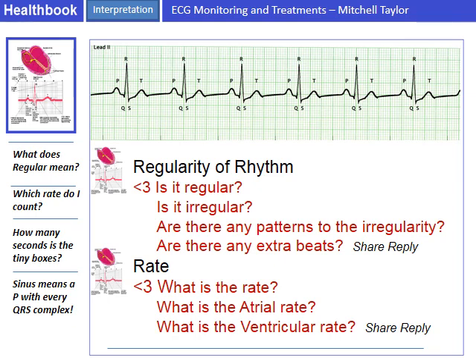Is this rhythm regular? So we would look at this and we would say, right, that's correct. Yes, it is. Is this irregular? No, it isn't, because we can see that every R comes down after the 25 boxes. And so our next beat, we would assume, would come at that time. If it didn't, then we would say, hey, that's an irregular rhythm. If it does, which this one does, it's regular.